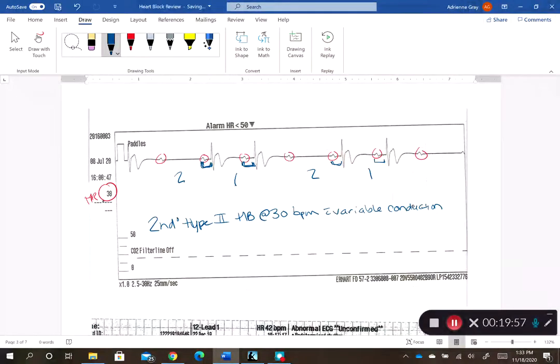This was actually a patient of mine, and they had a PE. So this heart block was probably brought on by hypoxia, and just all of that ischemia, that lack of oxygen getting to the heart because they had a PE, so they weren't getting good oxygenation.